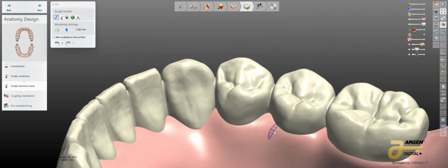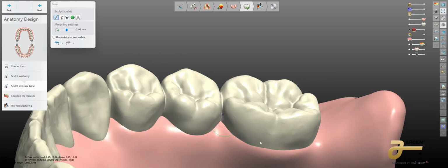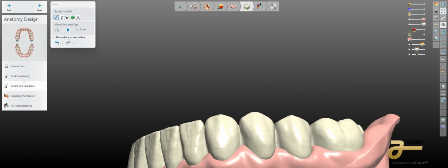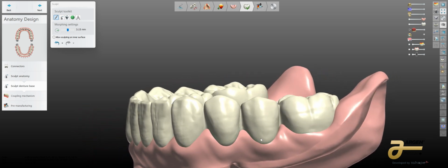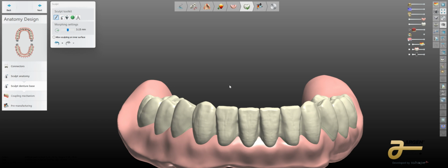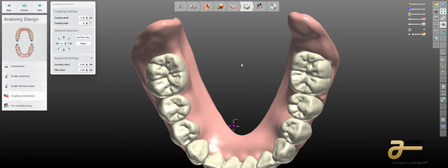And I can promise you, the reason I excelled at digital dentistry and All-on-X was because I've set so many dentures in my career. It helped me to come up with a better understanding of where that tooth should be to be able to function the most effectively. All right. So again, it's not absolutely perfect, but it's pretty darn good.